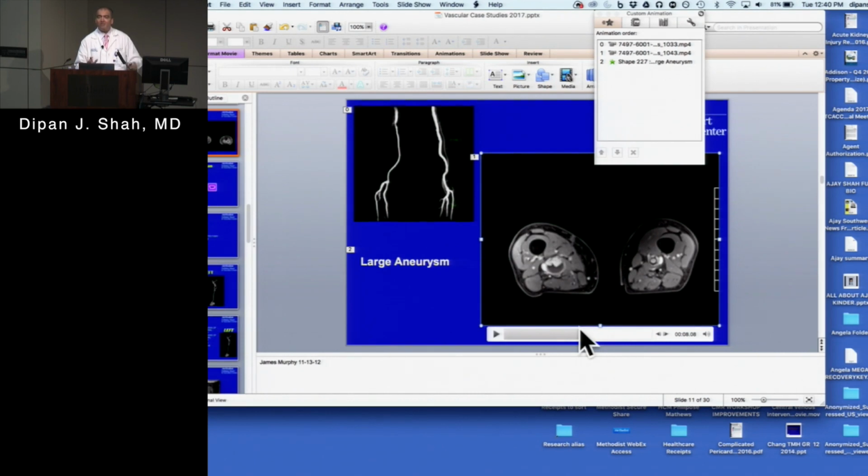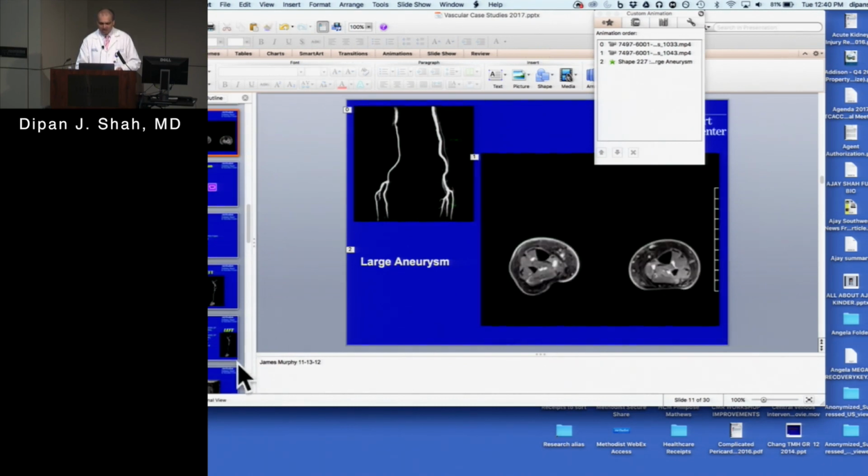And so you really need to make sure that you look at all of the images, and that's why as part of an acquisition, we don't just do an arteriogram and that's it. We always get a set of morphologic images which allow us to see the background tissue as well, because oftentimes the picture is very different when you see everything versus just looking at the arterial structures.